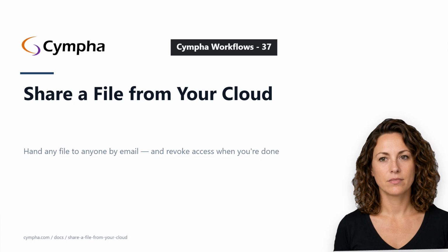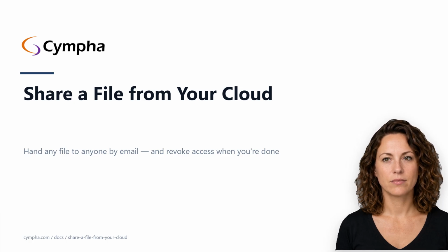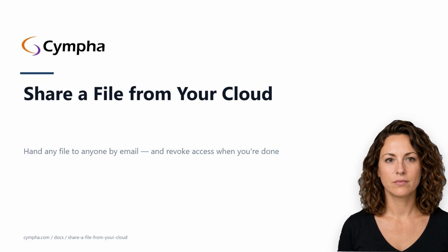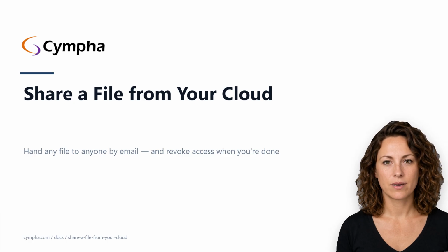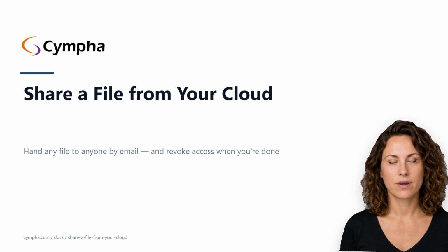Sometimes you don't need a case, you just need a colleague, a referring doctor, or a designer to look at one file. Cympha's share feature does exactly that: one file, one email address, done in under a minute. In this short lecture you'll learn how to send a share from my cloud, where you and the recipient each see it afterwards, what the recipient can and cannot do with it, and how to revoke access when you're finished. As always, everything comes straight from the written guide on cympha.com. Follow along on screen, or listen now and read later.